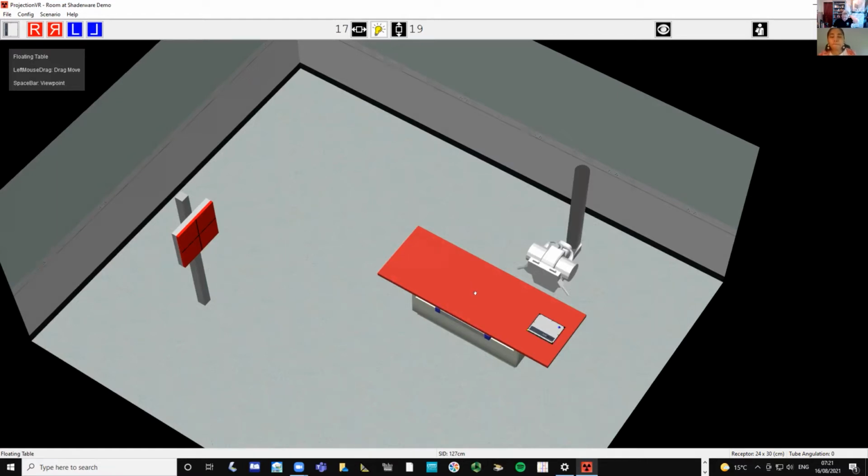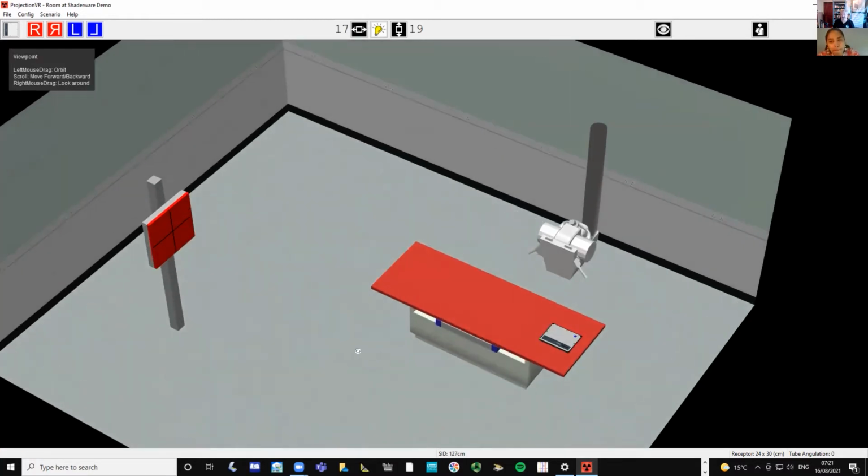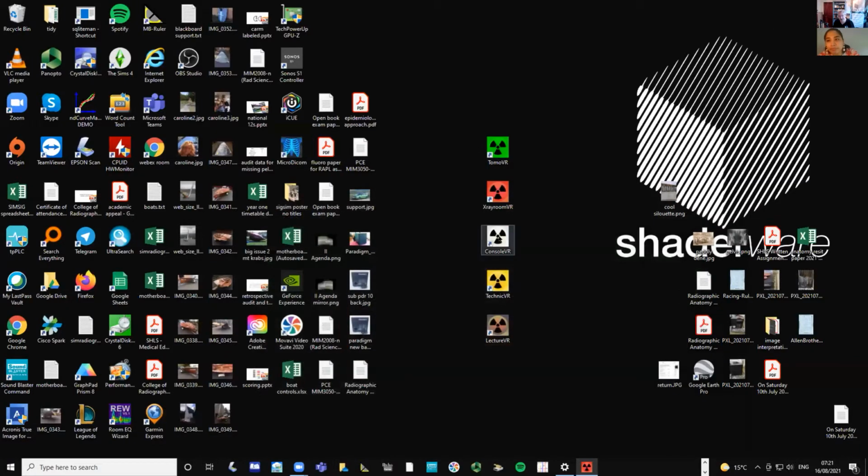And all of those things. Right. At any rate, would there be an image production after this, or is this just positioning software? Oh, no, right, yeah, so I'm going to show you the image production now. So basically we need a patient for that. So I'm going to go and get a patient now. So I'm minimizing this. I'm going to fire up the console now.